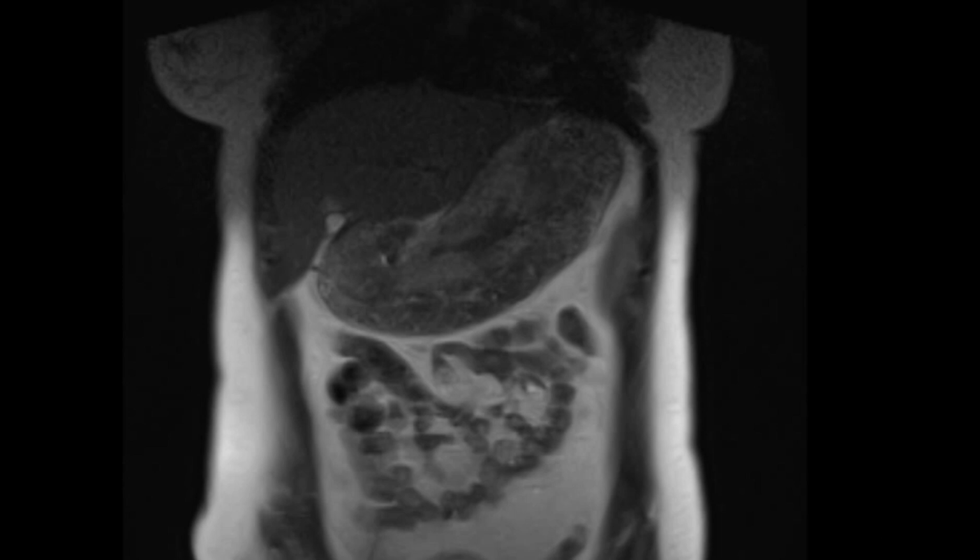Does this cause vomiting? It might, but here it did not. Sure, it might. Why not? Nice. Okay, good. Between the hairs, it traps air bubbles. It's not a mass. In a soft tissue mass, there will be no air inside, but it's a foreign body.